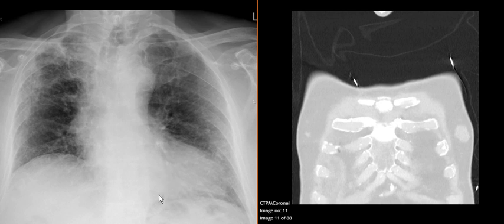So his volume on his left is reasonable, 10 and a bit ribs. On his right is a bit underinflated. His costophrenic and cardiophrenic angles are okay. On his left side, it's a bit blurry, and there might be a hint of air bronchograms behind the heart there. But there's also a distinct opacity in the right upper zone and a few other strange patches.